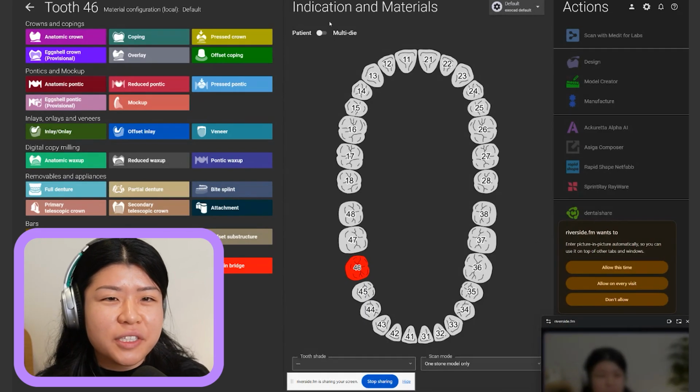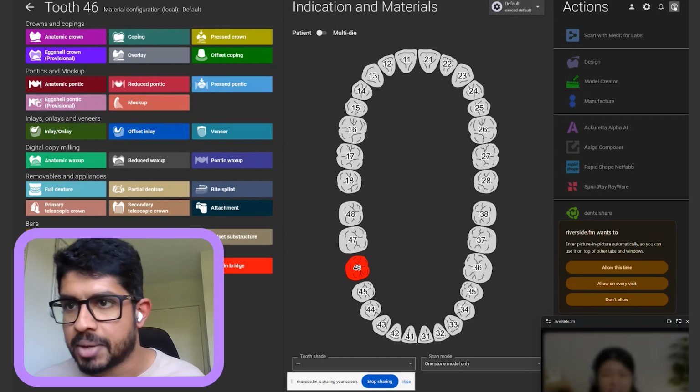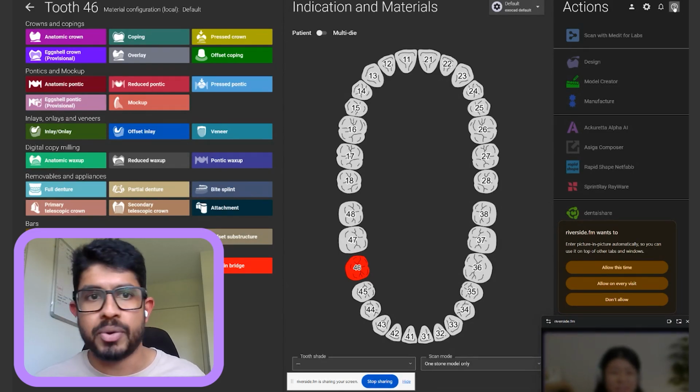Was that just a button? Where did you find that wiki? Oh, I'm so sorry. It's this helping, like a question mark, just up in the top corner. You just press that and it opens up immediately.